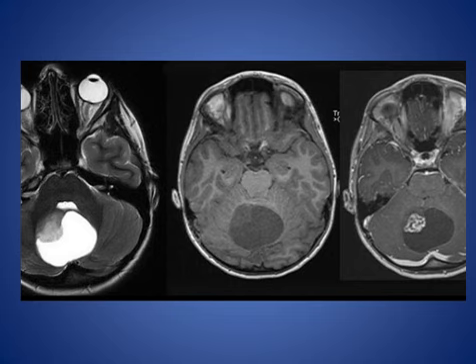Next case, this is an 11-year-old child with double vision, and as we see here, there is a large midline mass in the posterior fossa.